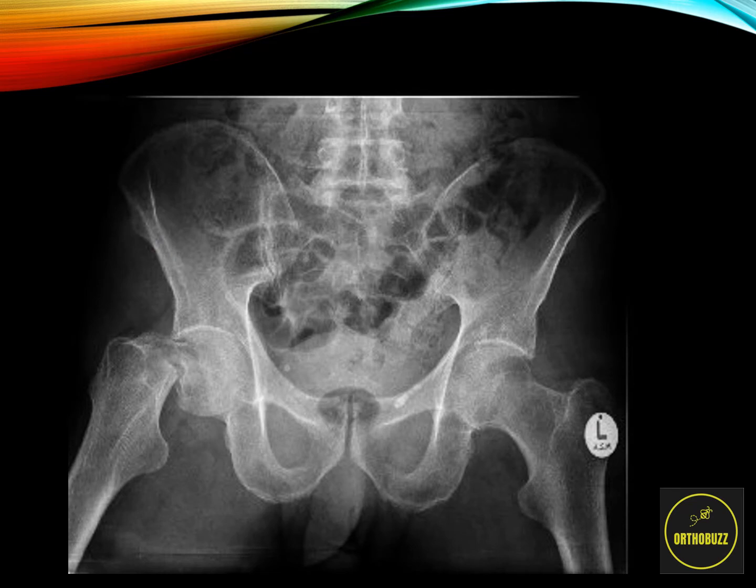So, having had a look at this fracture again, how would we classify it? Well, the capsule inserts along the intertrochanteric line here, and therefore this fracture is most certainly intracapsular. Classifying it further than that, we could see it looks like a subcapital fracture as it's just underneath the head of the femur. So this is an intracapsular fracture, or a subcapital, which by definition is intracapsular.